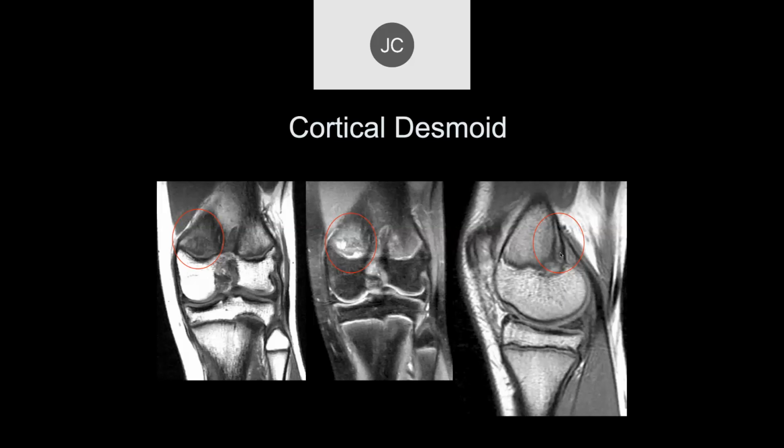John? You don't see any lysis on that particular image. So that would, as you said, be a leave-alone lesion. But I would still follow it. Wouldn't you? Generally, I don't follow up on these. Once it's recognized what it is, then in my experience they are usually treated clinically. And as long as there are no complications, we usually don't image it again.